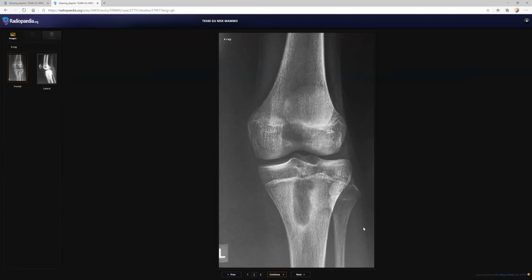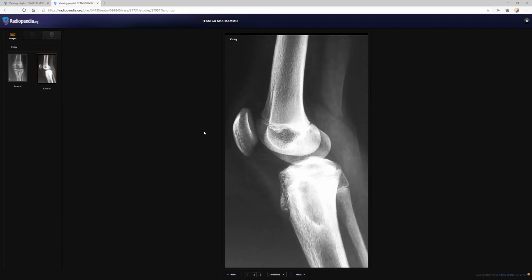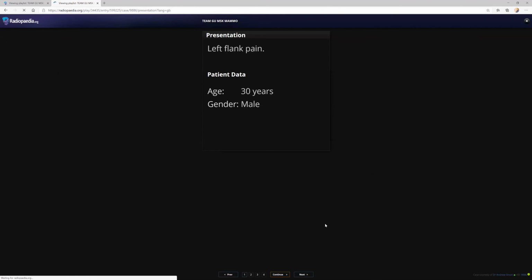The distal part of the femur looks okay, with no involvement of the joint space and no surrounding soft tissue abnormality. The fibula appears normal. I will go for the orthogonal view to confirm my finding. Yes, so this is confirmed on the lateral view as well. That's the tubular lucency. In keeping with the history of pain and a young adult, it's a case of Brodie's abscess. I will refer this patient to the orthopedic surgeon for drainage.